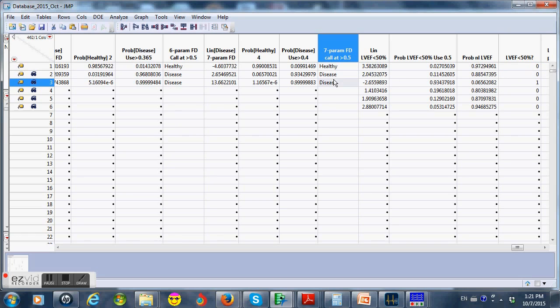And if we look in detail at patient number 2 now, remember all the disease scores were positive for patient number 2. That was our diabetic, but the LVSD score is negative. But here, patient number 3, the male, has a positive LVSD score as well. So most likely has some degree of heart failure by the LVSD A-ECG score call. The others are negative. Remember, this is also a snapshot score.